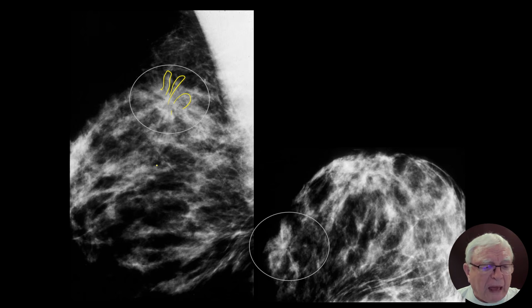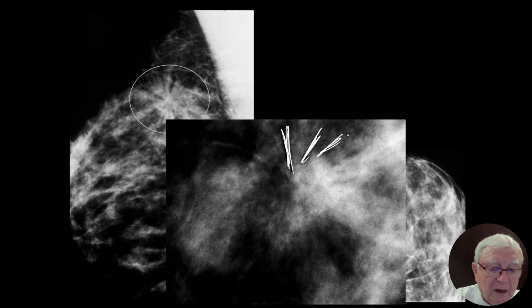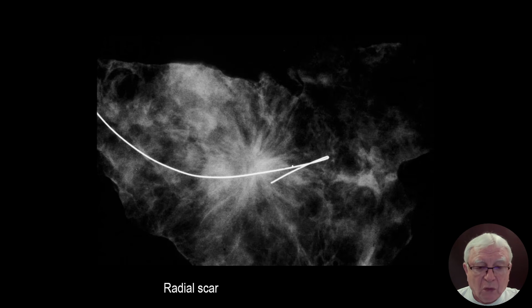It's not very black. I would have expected, probably now it's more of a black star here. You see that? I mean, I'm just drawing it white. But what is this? In these cases, I would probably go for a core biopsy, or why not this one? And I still don't know.